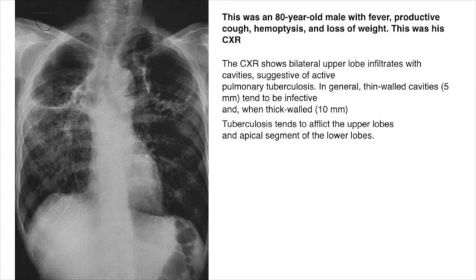You see in both apices of the lung this type of cavitation. We have a lot of cavitation here. You can see it over there, or this huge cavitation with fibrosis, which is very frequent in TB. So you have to pay attention to that; every time you see this, it is for sure TB. So what happens with this cavitation? It can get infected and become an abscess. It's very important to know that.